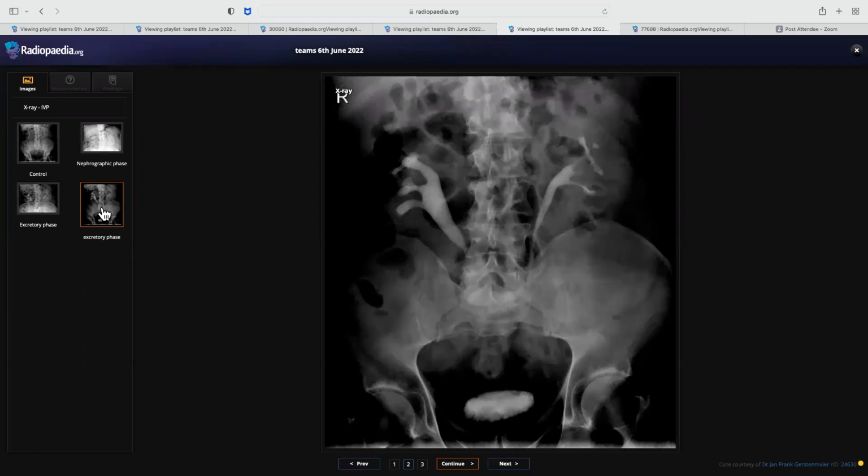I will convey these findings to the referring physician and request further assessment by contrast enhanced CT. If retroperitoneal fibrosis is diagnosed, it is also associated with other autoimmune diseases like thyroiditis, Riedel's thyroiditis. So I will convey my findings and correlate with any clinical data available for the patient.